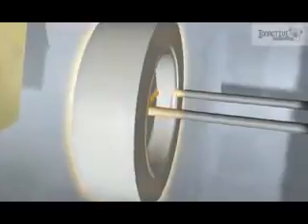The cathode emitter is a piece of metal that is heated by a low voltage supply. Electrons are liberated at the cathode by thermionic emission and are accelerated in the electric field between the anode and the cathode towards the target. The cathode is shaped to focus the electrons onto a small portion of the target, which increases the intensity of the X-rays produced.